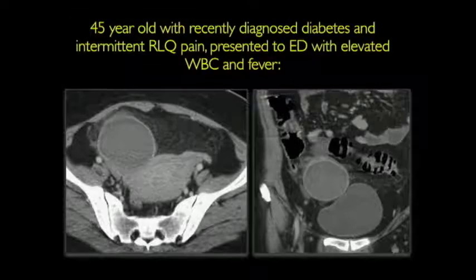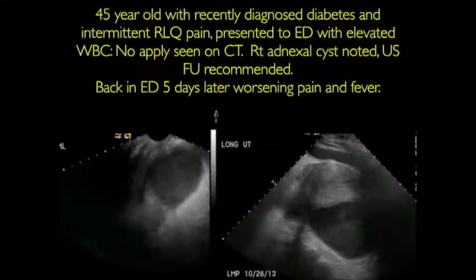This was a CT that came through the emergency room, a 45-year-old, recently diagnosed with diabetes and intermittent right lower quadrant pain, with an elevated white count. They said the appendix is normal. There's a cyst in the adnexa. Maybe follow up as an outpatient. But notice there's a thickening of the cyst wall. There's a lot of stranding. And I don't know that I would really leave that. And also, what then was the cause of the right lower quadrant pain?